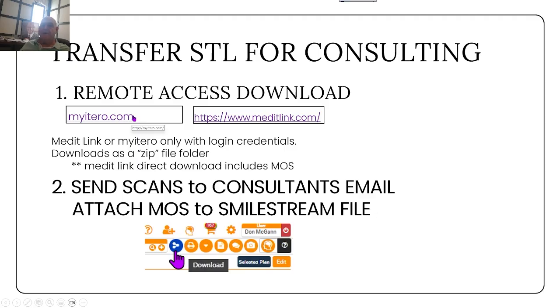So you provide the login credentials to your consultant, and then I can go in, download the scans for that particular patient, and in Medit Link, if it's a Medit scanner and there's a Medit Orthodontic Suite file, I can download that as well at the same time as the scans.